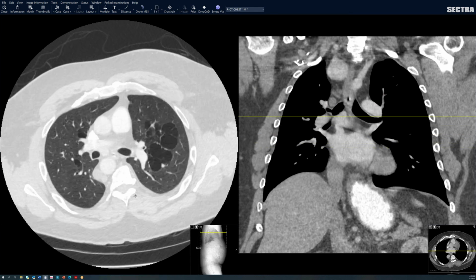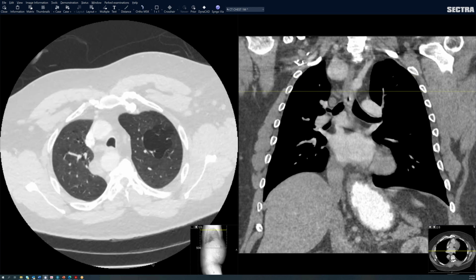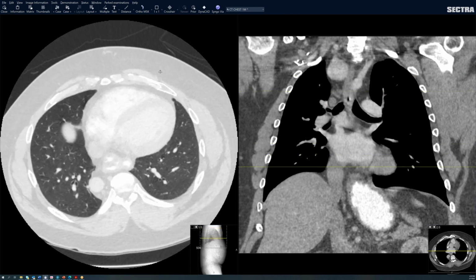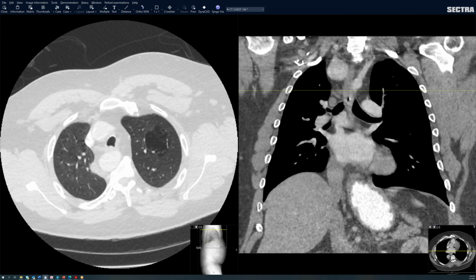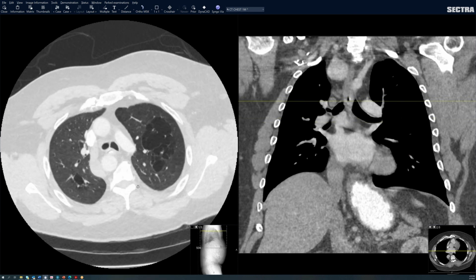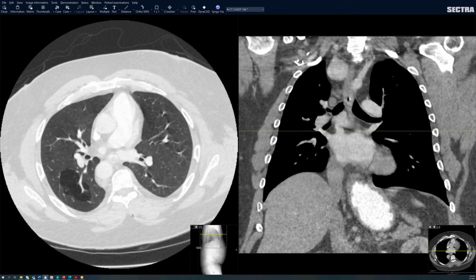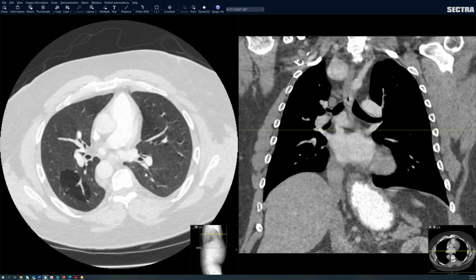This distribution would be highly unusual for this. Right, so it doesn't look like emphysema. It does look like cystic changes, but it's a very unusual appearance and does not fit in with the usual cystic lung diseases. I guess what I mean is, if you were able to put your finger in the middle of that, do you think you'd be touching the lung, or it would just be in air? So you're thinking air trapping. So if those are areas of air trapping, that's your question? Or just that it's abnormal lung parenchyma as opposed to a cyst.